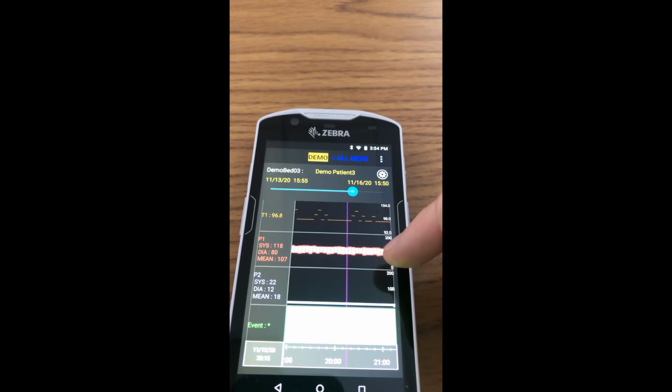Press the settings icon to change the trend graph displayed to show 60, 12 default, 6, or 4 samples per hour. After a new value is selected, the graphical trend window is displayed using the new samples per hour.